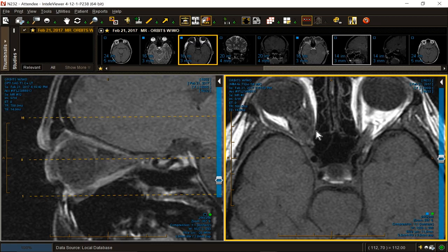The diagnosis you probably have now concluded is meningioma of the optic nerve. So it is not a second optic nerve glioma. It's important to make this diagnosis because if you biopsy a meningioma, you will make the patient blind. The treatment is radiation. This is a radiographic, not a histologic diagnosis.